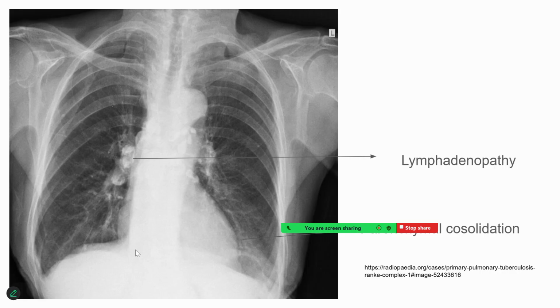A typical primary tuberculosis presents with lymphadenopathy, usually seen in children. The appearance of the lymph node in tubercular pathology is very classical. The density of these lymph nodes is higher, and the shape is almost perfectly spherical. The core area of the lymph node has a lesser density, and the peripheral area has a higher density, which is characteristic of tubercular lymphadenopathy.